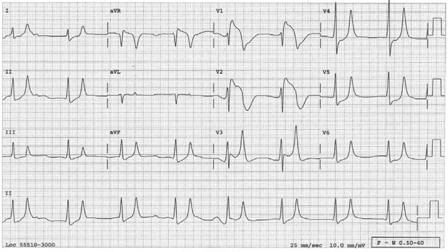I just wanted to share with you this very interesting ECG, which was taken from a book called Atlas of Electrocardiography by Dr. K. Wang from the University of Minnesota. When you look at this ECG, you can appreciate that it doesn't look like a normal EKG. For a variety of reasons, if you look at V1, you have a very massive ST segment elevation. Same thing with V2, and in V3 to a lesser degree. You can also appreciate a tall T wave in most leads actually.